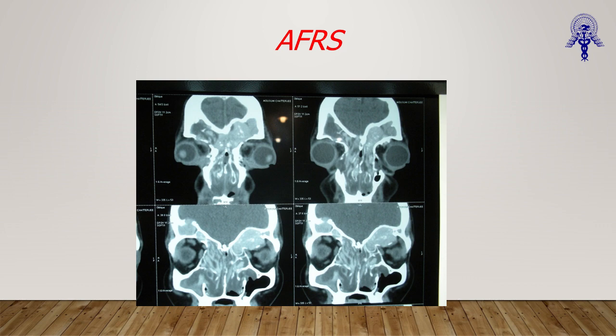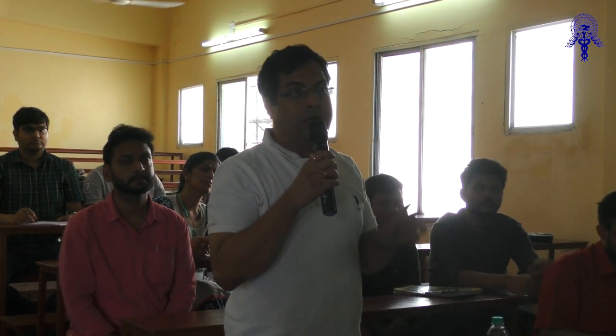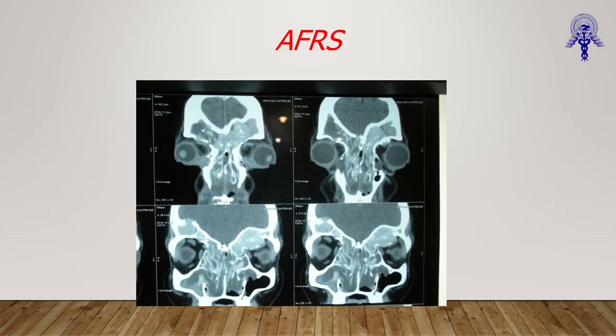I have already told the diagnosis. Tell me which sinus has what, someone please tell. It's a coronal section, showing a soft tissue window, you have to say that. So it's a soft tissue window, because the soft tissue delineation is visible. Showing the double density opacity involving both the frontal sinus, more in left, and involving both the anterior ethmoids and maxillary cavity, and right maxillary cavity.